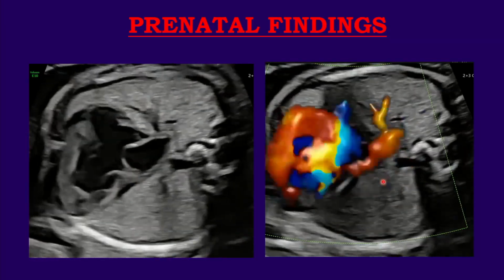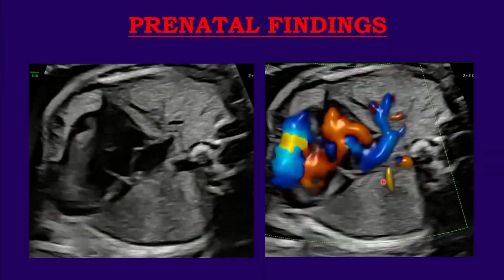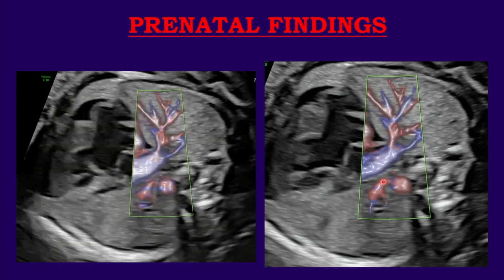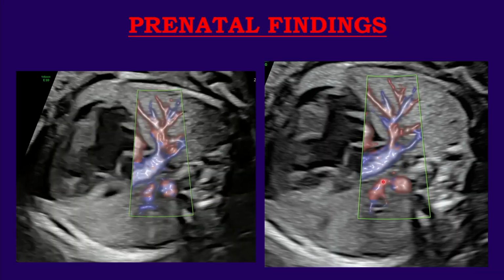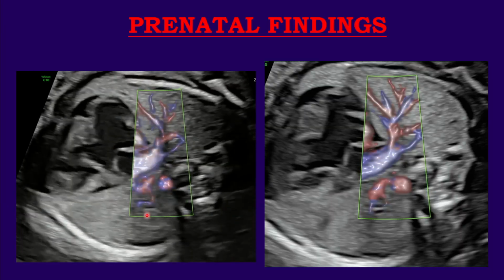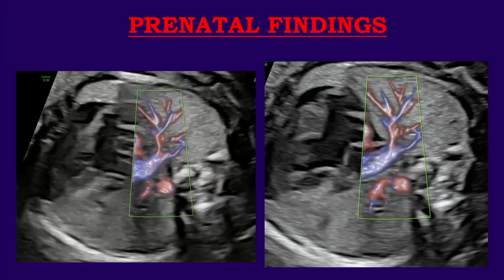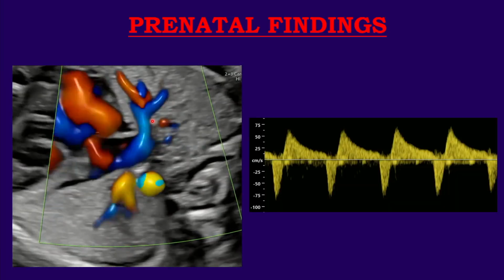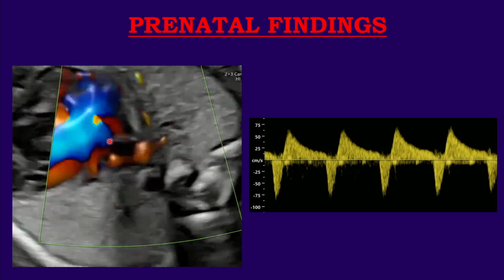And this is why we need to follow the guidelines and find at least one pulmonary vein on each side draining to the left atrium. Well, so we are not sure. We want to try all our techniques. Maybe that regular color is not sensitive enough to demonstrate that, so we can see here that even the very sensitive technique that allows assessment of microvasculature shows that these left pulmonary veins are not going to the left atrium. So we can see the typical blood flow in the pulmonary veins on the right. Typical for hypoplastic left heart syndrome, that's some degree of the restriction of the foramen ovale.